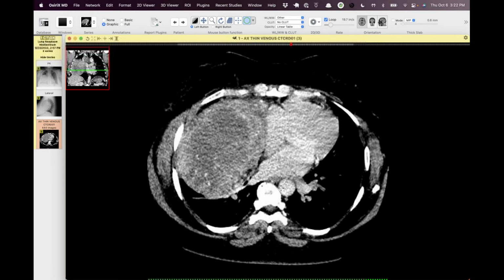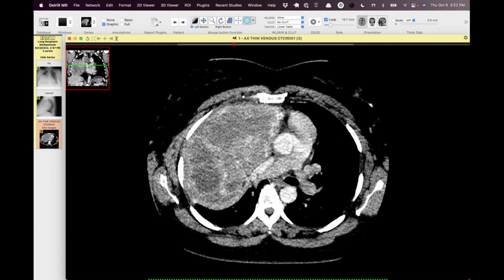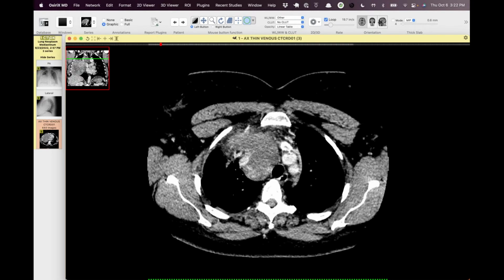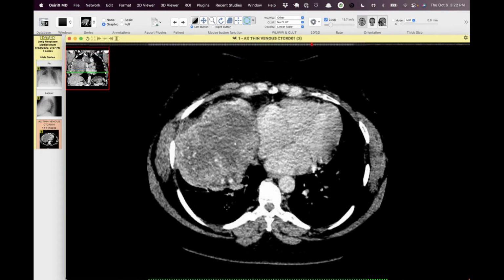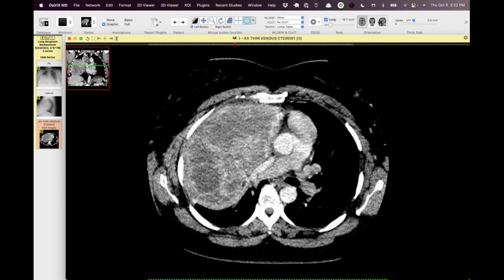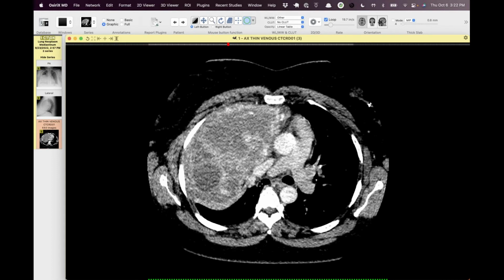Yeah, and I was still just trying to find a ton of vessels that are arising from thymic. I think these are all thymic vessels right here. Some of them even from internal mammary that feed this thing. I didn't see any good feeders from the lung. Maybe this portion, maybe they'll find a stalk when they go in there. This arises from the visceral pleura.